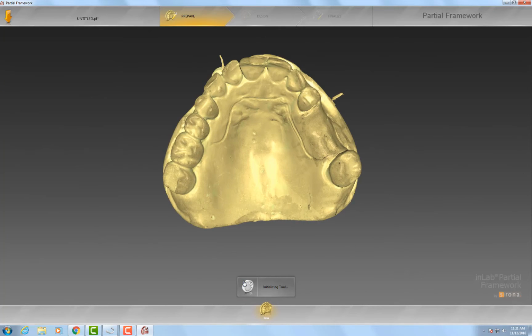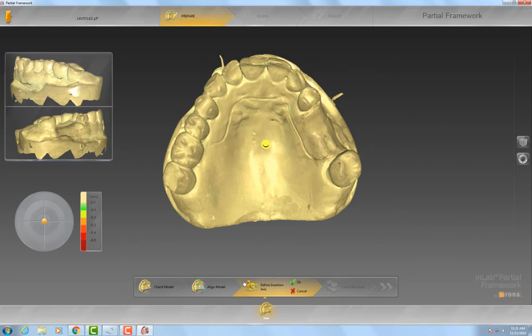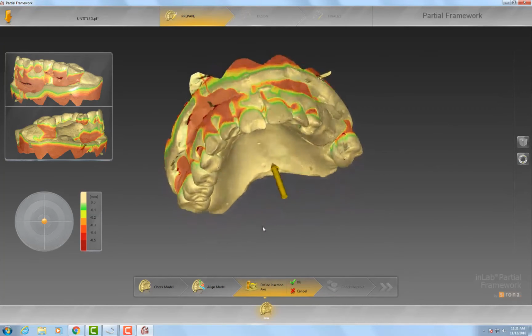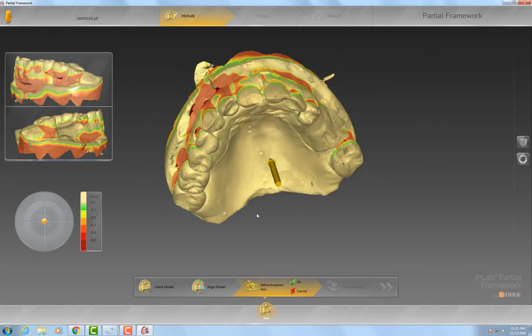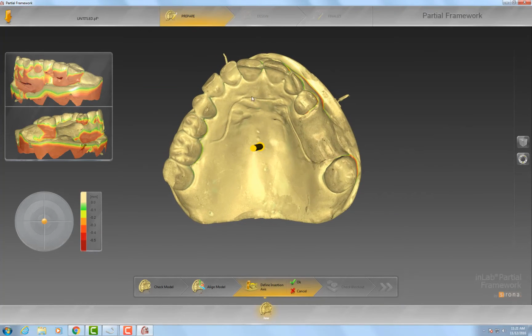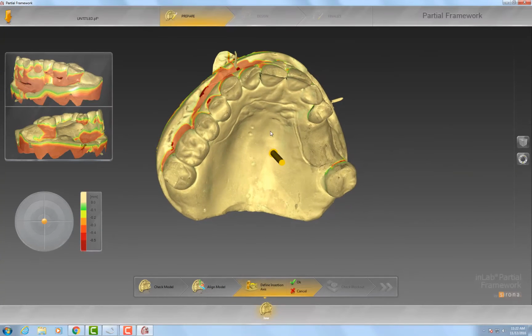So from here, it's just going to give you a straight down axis of control. What it will do is show you where your actual undercuts are and where possibly the blockout can be located. This is where it starts to not only pay itself back if it were at a charge, but it's free. So this goes straight into profit at this point, is that you don't have to block out the model and you don't have to dupe a blocked out model, because everything will be done for you in this software. So this is part one.